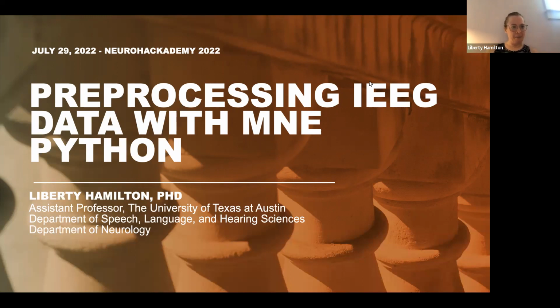And so, as Noah said, I'm going to be talking about pre-processing intracranial EEG data with MNE-python.